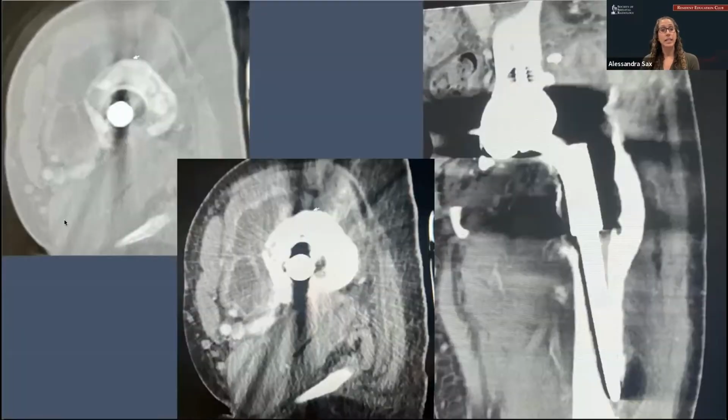This patient got a CT scan, and we can kind of re-see those findings within the bone. So we see that there is lucency surrounding the femoral stem on the bone window, this thickened periosteum around the femoral diaphysis, and then actually some erosions posteriorly and then laterally. And then on the soft tissue windows, we can see those collections a little more clearly. So, rim enhancing collection surrounding that femoral stem emanating from the cortex, and then also emanating from the hip joint itself. So just collections around the hip joint and the prosthesis and loosening. So this was actually an infected prosthesis.